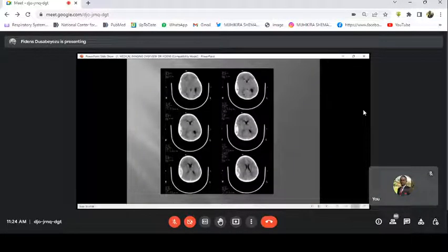For example, these are images, axial CT of the brain. General X-ray cannot produce this image of the brain. These are different slices at different levels, because this level here is different from here. Here, like now, you cannot see the ventricles. But from here, you can see the ventricles. From there, you can see them even better. Here you can even see the posterior horns. Here better. So those are different levels. Those are slices, cuts of the head.